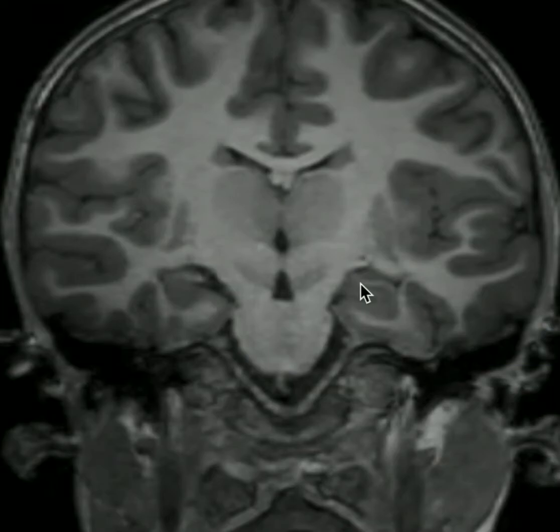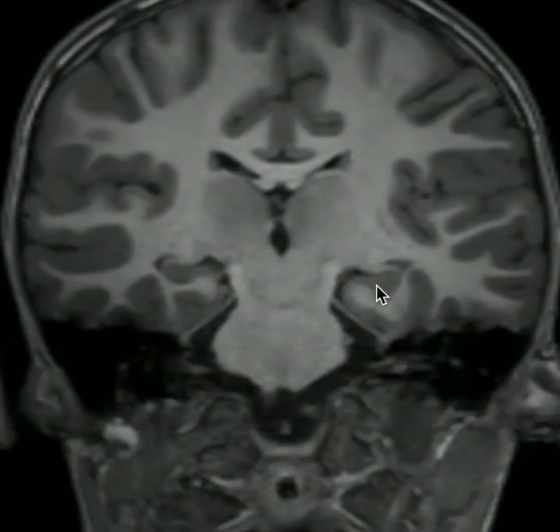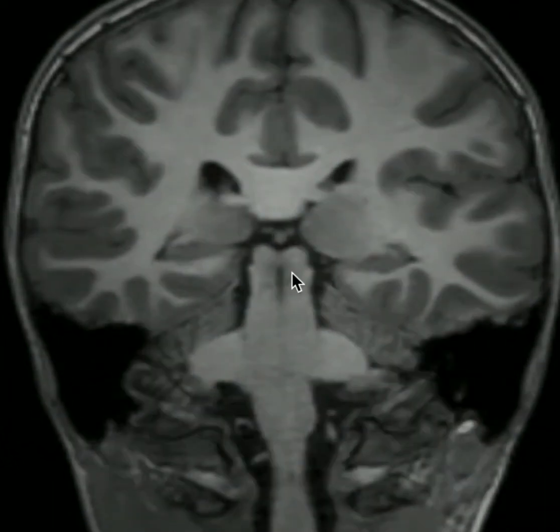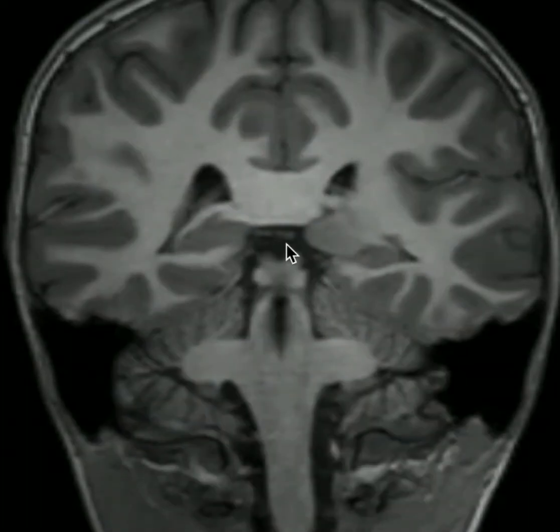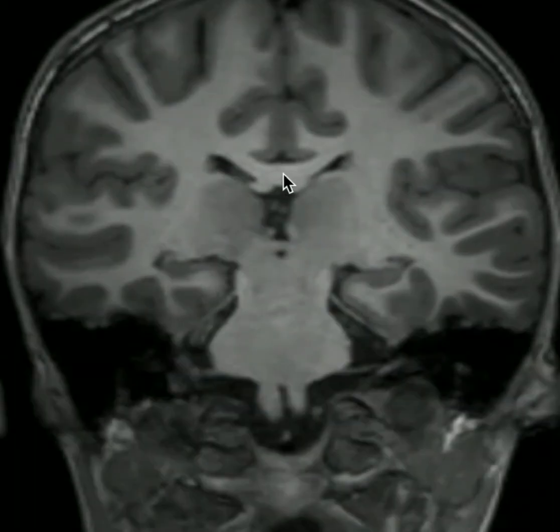As we continue more posteriorly, we're now looking at our hippocampal bodies, which run adjacent to the brainstem. As we continue further posteriorly, beyond the posterior border of the brainstem, here are our superior colliculi and inferior colliculi, and here's our quadrigeminal cistern. There are thin strips of gray matter that curl around posteriorly and then dorsal to the corpus callosum, forming the indusium griseum. These are pretty difficult to identify, but can sometimes be seen, if I go a little anteriorly here, just over the splenium of the corpus callosum as a confluent area of gray matter.